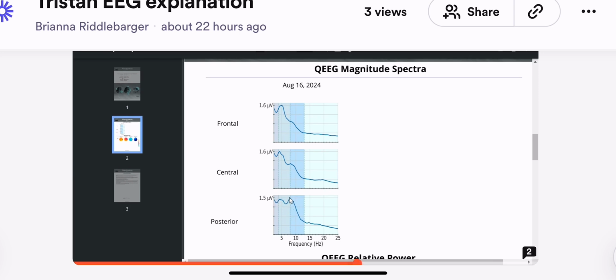And what's notable here is this bump is almost as high as the alpha waves. So how tall it is impacts the severity. This is taller than the alpha wave that's present. And then here is definitely taller than. So this theta wave activity that we're seeing is really clinically significant. It's probably the main source of his symptoms. Like I said, it looks like drug exposure. What I see with alpha waves looking this way, sometimes I see with concussions where they're a lot slower than they used to be and where they don't match up. But I definitely see history of drug use here.